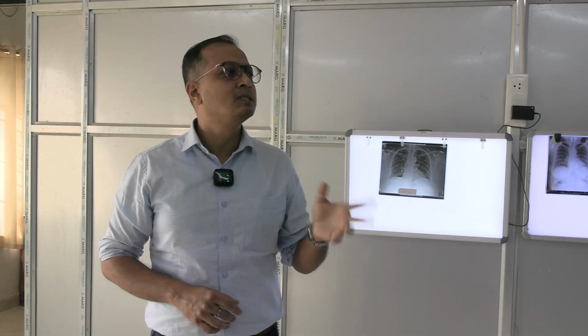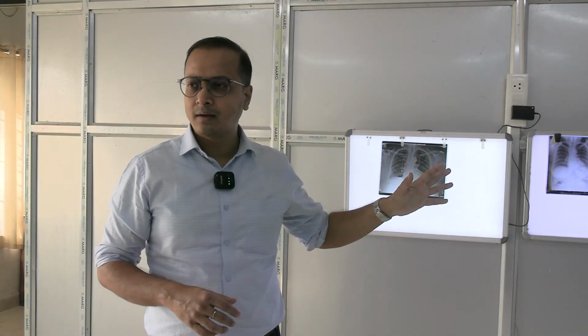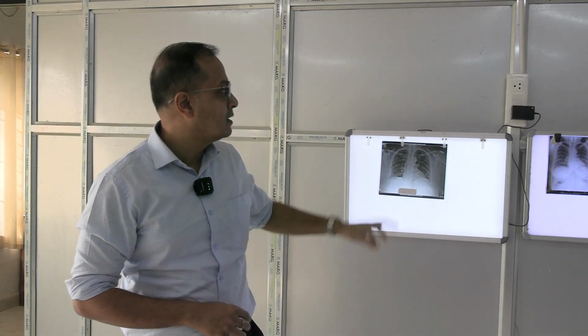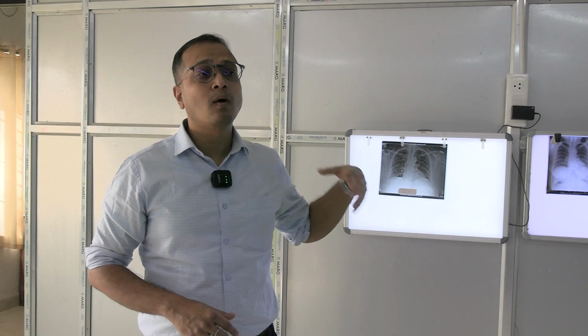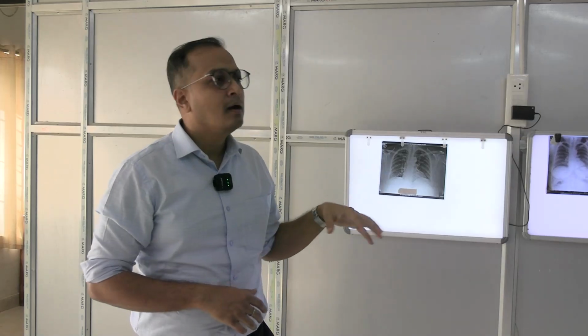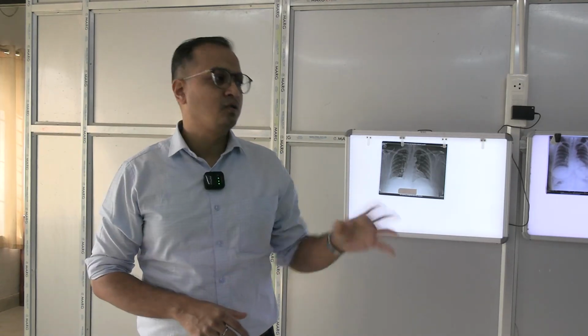By default, it is the PA view which is given here today, and the lateral view will be given likewise on the lateral views. So you have to understand these views. Along with the view, what areas are projected in this sciagram picture? That means showing what region, that particular region you have to say. And in that region you have to figure out whether you are seeing bony structure and soft tissue structure. If you are seeing some bony structure, what bones are you seeing, and what bones are making what kind of joints in that region.